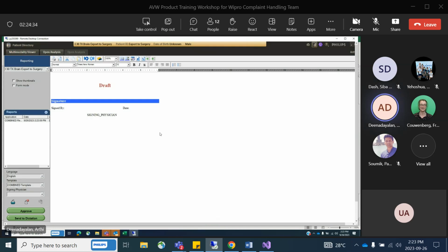This is the reporting tab. Before selecting anything, see this is the study that you're using. This is the same study as displayed here. Click on this drop down, click on the summary images. You will see the image that you sent to report.